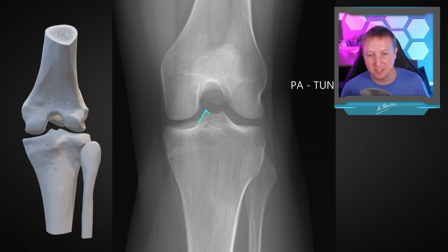We can see the tibial eminence and the tibial spines here really nicely, and we get, like I mentioned, that really great shot of the joint spaces. It's not weight bearing, so that's the main thing you have to consider. We tend to always do our A to P knees weight bearing, because that's what's going to give us a true representation of the load bearing joint space, which may be artificially widened when people are non-weight bearing.